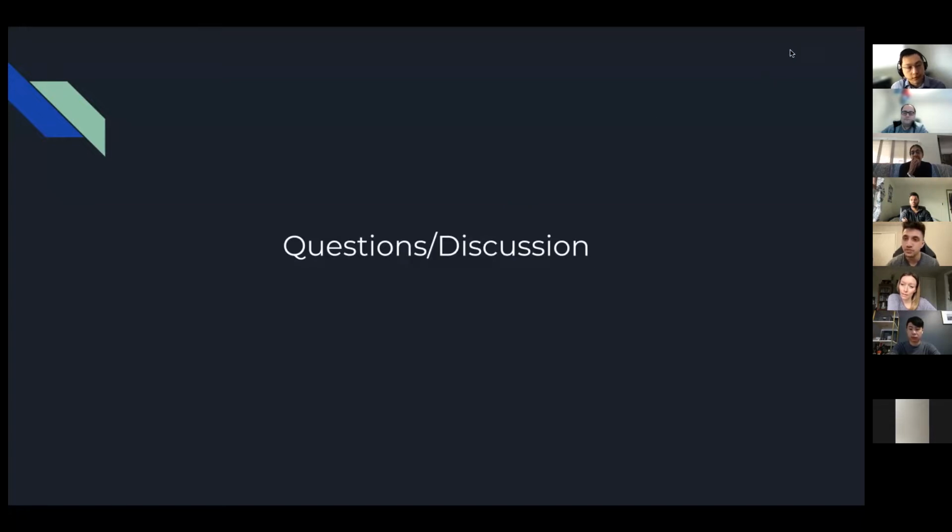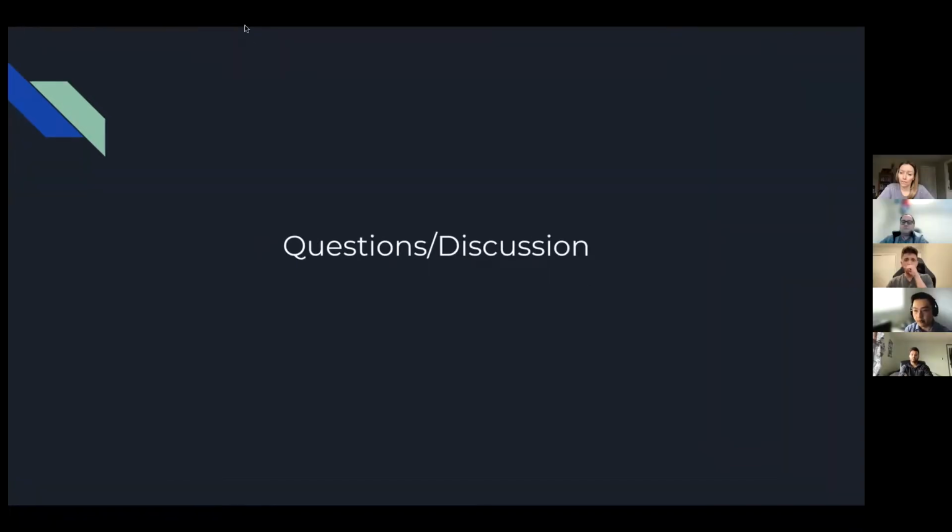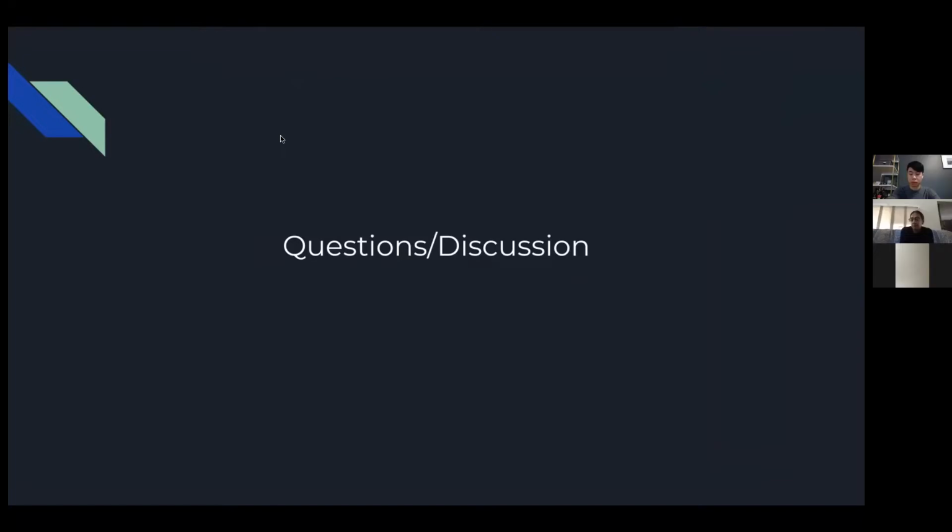I think one of the main foundations of how I want people to do POCUS is still to focus on the basics first. Start with the thoracic scan, do some basic cardiac scans, get some color Dopplers on the valves. From that, you can gain a lot of information on how to manage the patient. So like Hamza said, if on the basic cardiac ultrasound you already see evidence of severe RV volume overload, septal flattening during diastole, it almost doesn't matter at that point what the IVC or the VExUS shows, because we know we have to offload that RV and get the volume off one way or another.